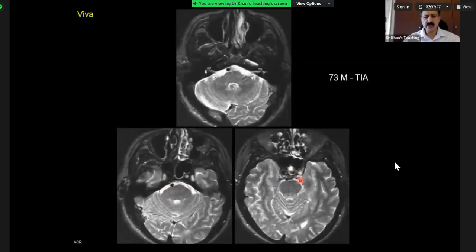So you have to develop your checklist of looking at the basilar artery, which was beautifully mentioned. Then your checklist is the cavernous portion of the internal carotid artery, which presents as a flow void. And here that flow void is lost. You can imagine that this is the petrous ridge and the carotid canal is going through it, and even here there is high signal. So loss of flow void means complete thrombosis of the left ICA. Well done.